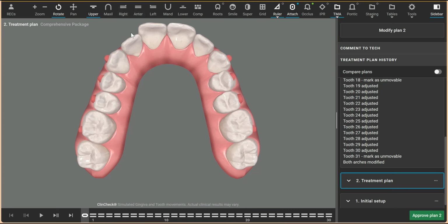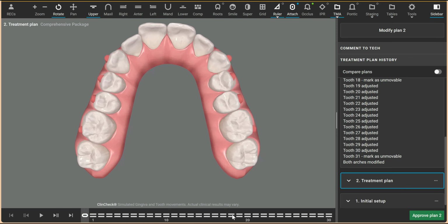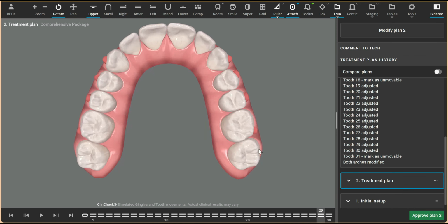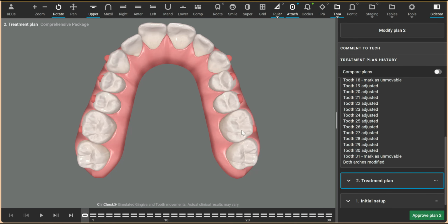So here's the treatment plan. I always look at the arches first and I say, is this okay? What's okay and what's not okay? What's not okay is the omega form, so we have to expand out. But the molar teeth aren't bad. They're performing a lot of movements. I'm not even concerned about the rotation of the molar teeth. Again, she's 30 years old. You could rotate the molars, but the more you move posterior teeth, the greater the treatment time, and you're increasing the complexity of the case a little bit.